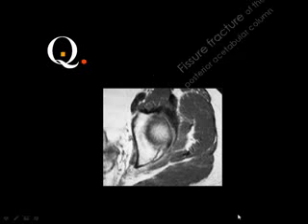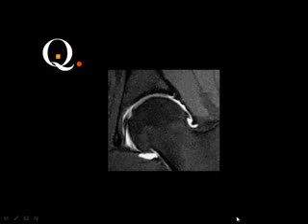Sorry? Osteochondral? Osteochondromatosis. The fracture. Where is the fracture line? Yes, this one. This is just the muscles and the capsule, and so this is the fracture line, and it is in the posterior column of the acetabulum. Effusion only? No, the bone marrow also. Bone marrow?